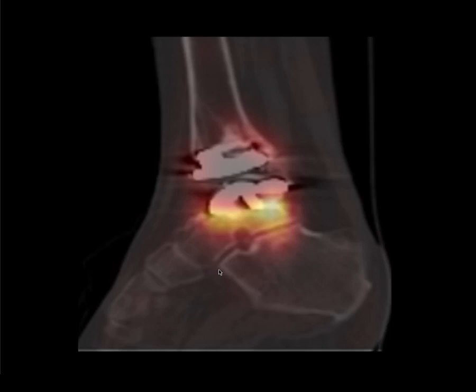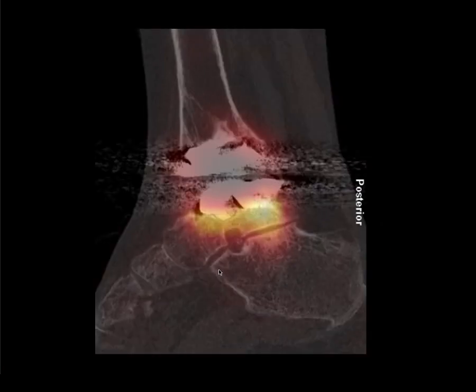Now you can do a high resolution image, which we have here, and you can notice that there's superior quality to this scan, so that's helpful if your camera has it. You can also do metal artifact reduction imaging with some scanners. You can see here we have quite a bit of metal artifact, beam hardening artifact. It hasn't caused too much problem here, but it can sometimes in prostheses.